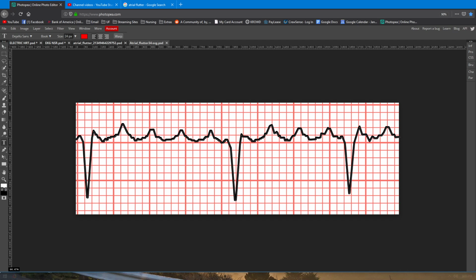If you have any questions, let me know. Atrial flutter, same thing as with AFib. It can give you a bit of a bad feeling, but I wouldn't necessarily call it a super acute thing that you should worry about. Something that should be dealt with differently. All right.